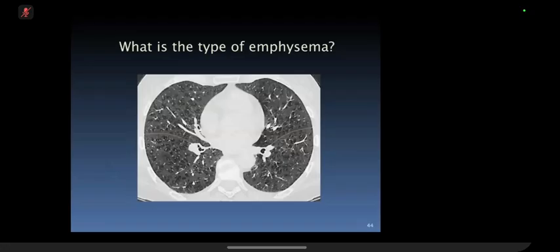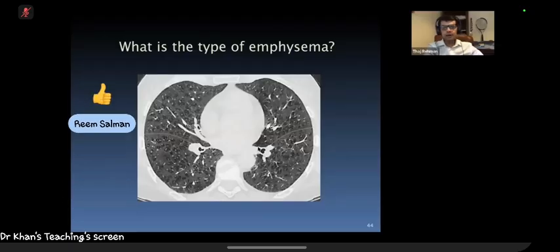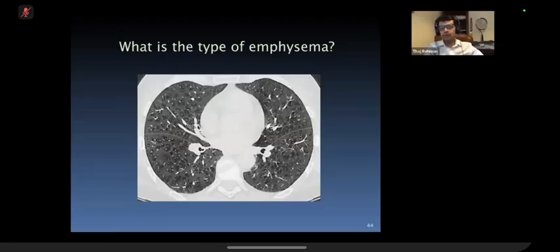This is centrilobular. It is centrilobular emphysema, and you have seen so many cystic lung diseases. Can you all see the centrilobular artery inside the cystic airspace in the centrilobular emphysema here? This is not a lung cyst because you can see a centrilobular artery. Are you clear on that? I hope the rest of the people are also looking at it carefully. You can see the centrilobular artery, and there are no definable walls. Unlike an LAM cyst or an LCH cyst, there are no clear walls. It's just cystic airspace surrounded by normal lung.